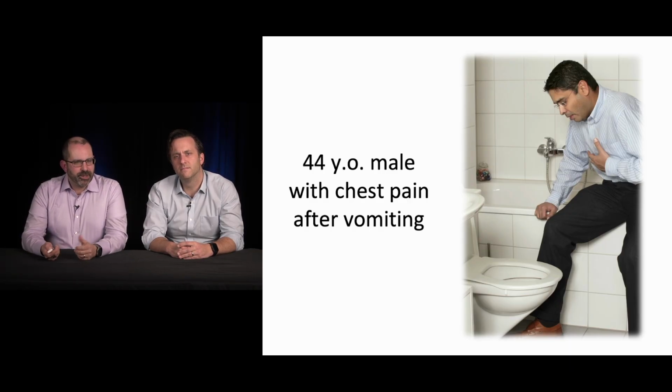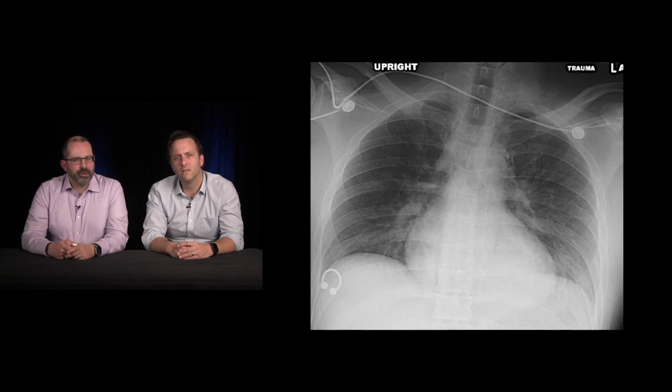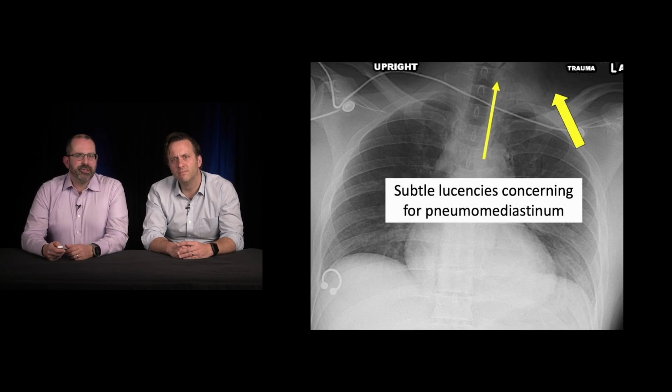All right, so switching gears a little bit out of the trauma realm, this gentleman comes in with pretty bad chest pain after vomiting. What do you think? Actually, it doesn't look that bad. It really doesn't. If you look real closely at this, you see that there are some subtle lucencies up in the soft tissues, up in the neck.